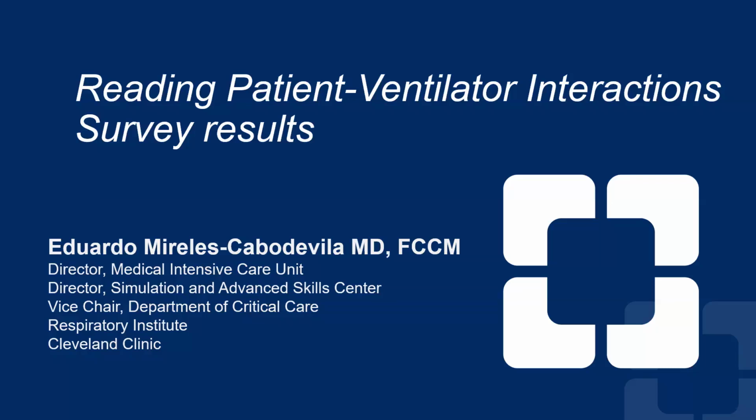So the first basic rule that I want to put out is that the patient is the reference signal. When we're talking about the interaction between the patient and the ventilator, as we go over all the cases today, when you hear us say late or early, it is in reference to the patient.